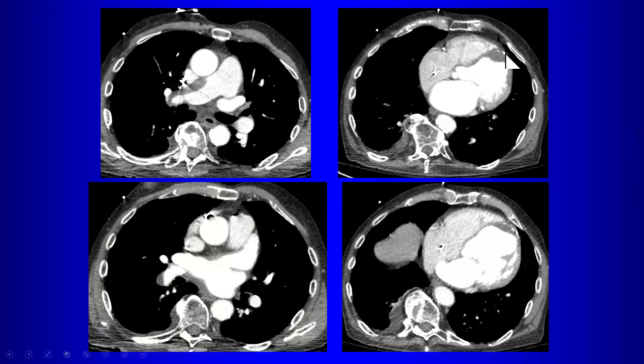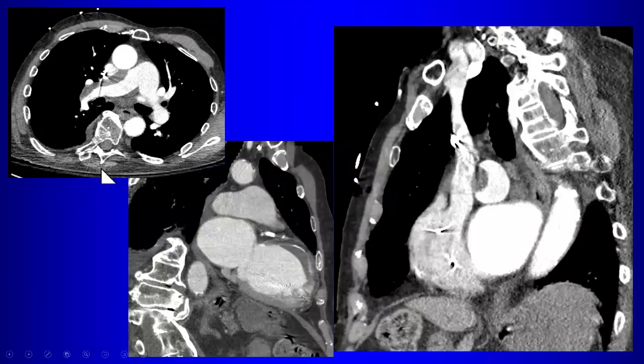What is this stuff? Calcification. There's calcification in the apex of the ventricle, right? So there's an aneurysm, a mature aneurysm there in the apex of the ventricle with calcification, and this is thrombus in the apex from a prior myocardial infarct. And this patient also has chronic PE, so multiple problems with this patient.